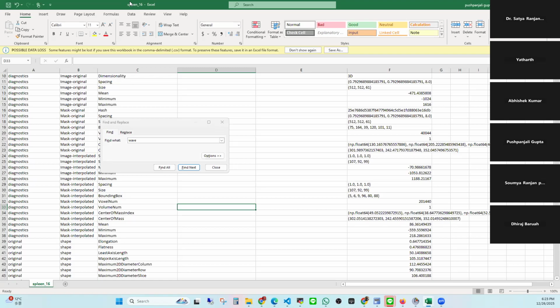And if we have liver tumor, spleen, and also pancreas and pancreatic tumor data, with 100 cases for each class, then we just use those data and go for differentiation of tumor or differentiation of organs based on the requirement of the physician, of course. So this is what you can do, and just continue.